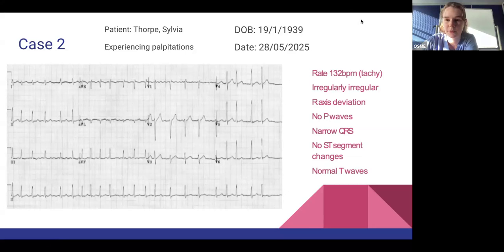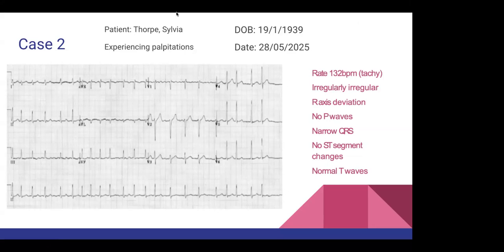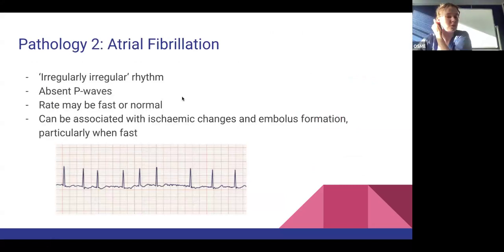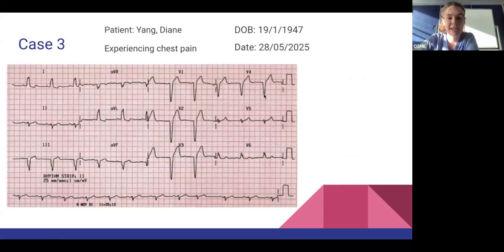So does that clear that one up before I move on? Yes. Cool. Right, atrial fibrillation, we covered. Case 3, have a look at that for me. Have a look at the age as well, might tell you something.